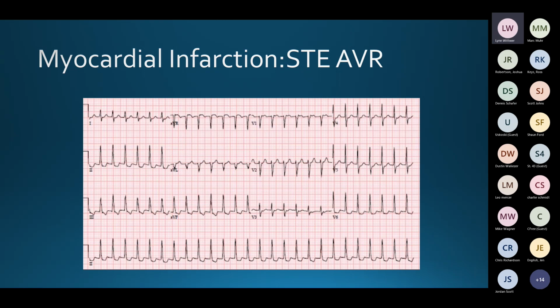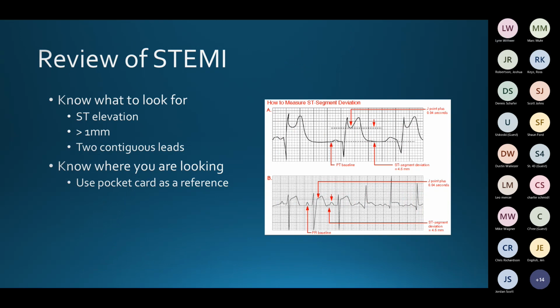He didn't have any other reason to have the ST elevation in AVR. He didn't have things like hypokalemia or digitalis toxicity or anything like that.